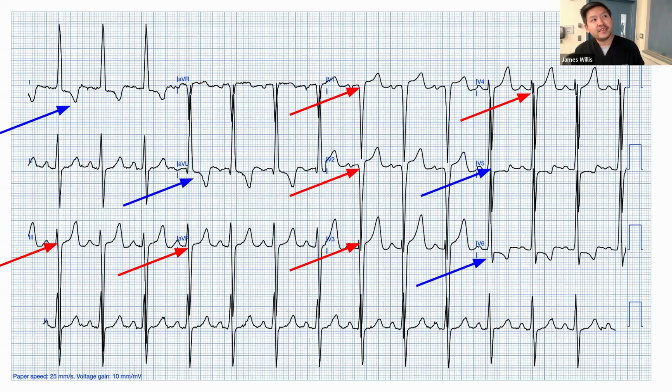If you look closely, there's 1 millimeter elevations in III and aVF and ST depression in aVL, which are reciprocal changes, right? So you could interpret this as an inferior, even an anterior. It's kind of a weird distribution. Someone with crushing chest pain, diaphoretic, maybe you do call it, because the LVH strain pattern isn't really, you can't rule out an MI.